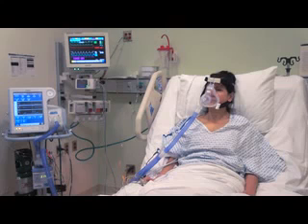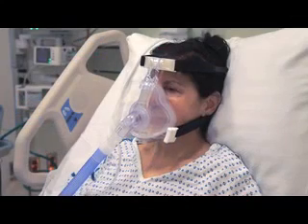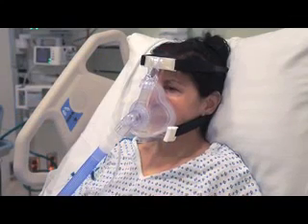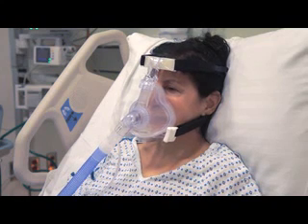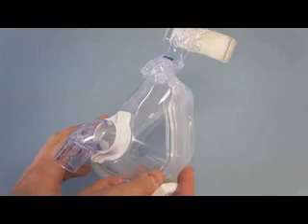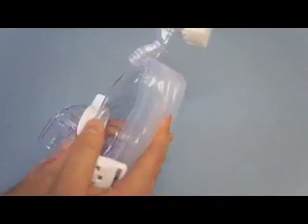The defining feature of BPAP and CPAP is the interface between the patient and ventilator that provides non-invasive airway access. In most cases, this interface is a mask. Many types of masks are available, but in urgent care situations, the oronasal mask is most common. This mask has a silicone cushion that forms a seal around the nose and mouth. If applied too tightly, however, this mask can be uncomfortable and abrade the skin on the bridge of the nose.